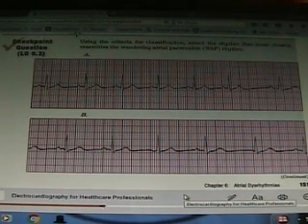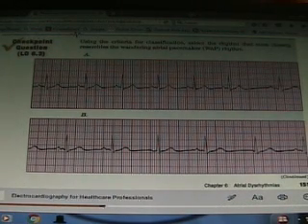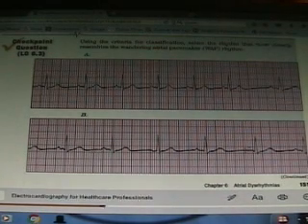Now, let's look at both of them. Did they all have a PQRST? Yeah. But let's look at the one on the top. Let's look at the PR intervals. Look at this P wave. It's what? 3 or 4 boxes. Little boxes. 1, 2, 3, 4. Right? The space in between here and here. It looks pretty even, doesn't it? Even though it disappears a little bit here.